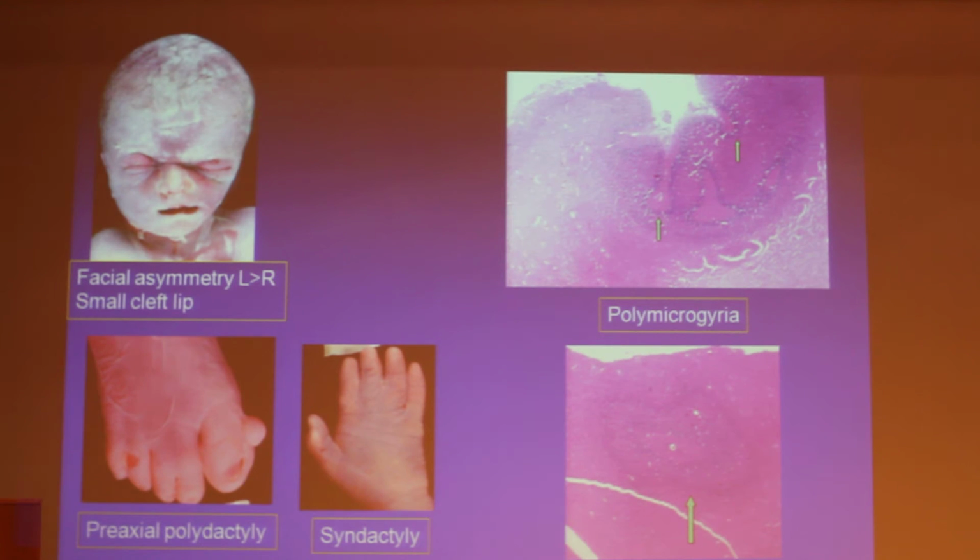This fetus had so many other abnormalities. He had a preaxial polydactyly, he had syndactyly, he had all kinds of hamartomas in the abdomen. I guess if at that point in 2000 we had looked at the whole body and used the MR for that, we would probably not have missed the other abnormalities, and this was also proven on histology.